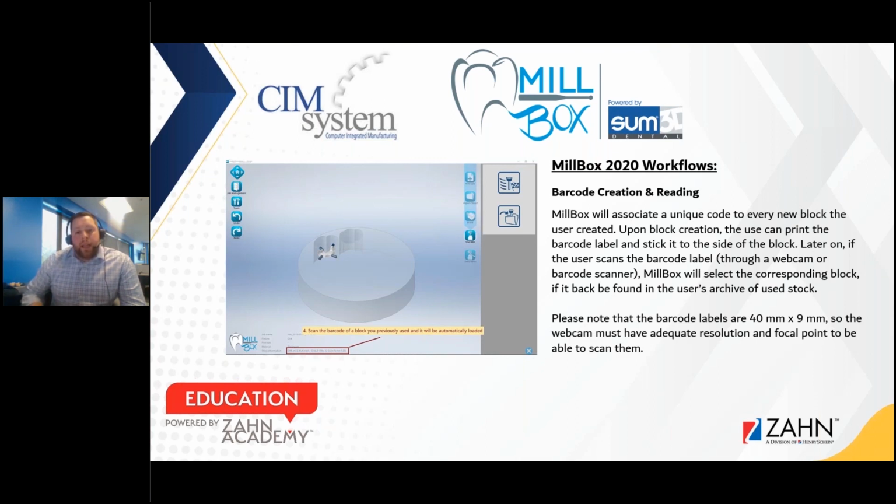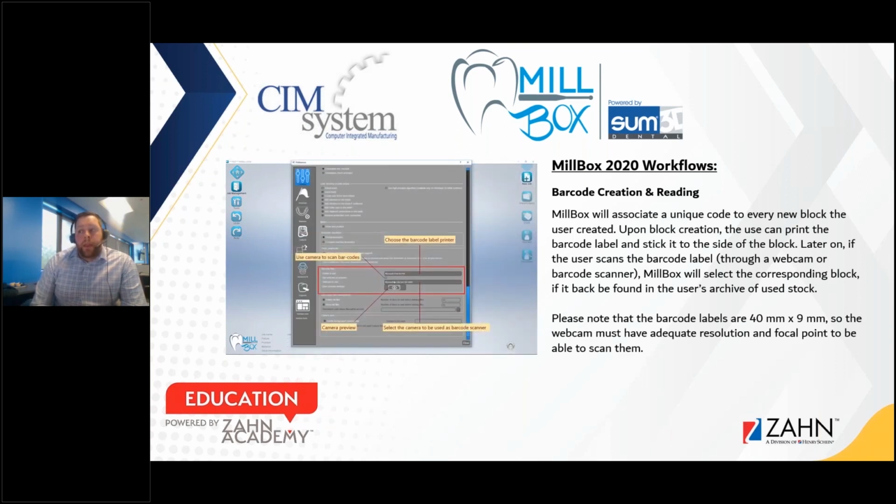applied to that puck and use it for searching later on when we want to go back and use that puck again, or if we wanted to decipher for different types of inventory controls, you can read those barcodes accordingly. The barcode is going to give all the unique identifiers that are going to be found in the job name itself or in the stock name, which you can see here pointed out in the slide. And then these are the settings that we have to adjust those individual barcodes.